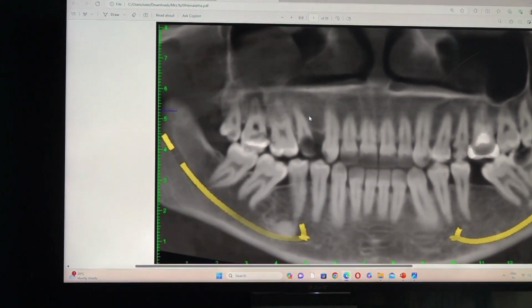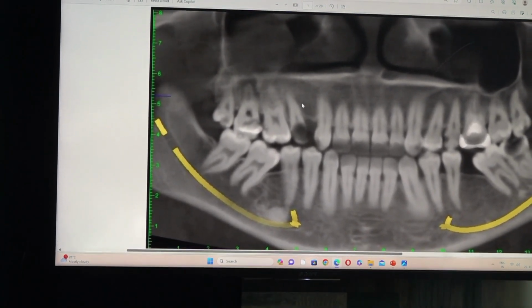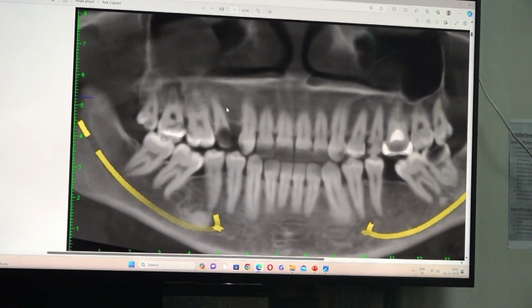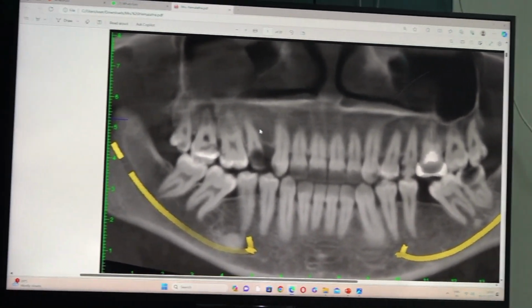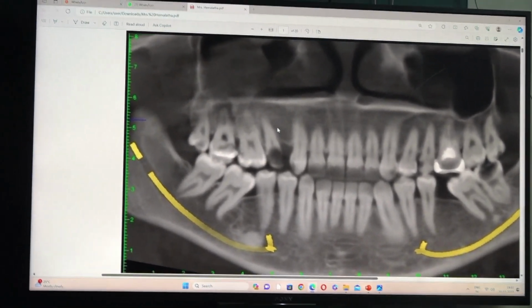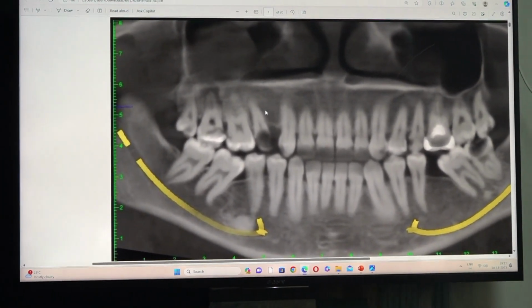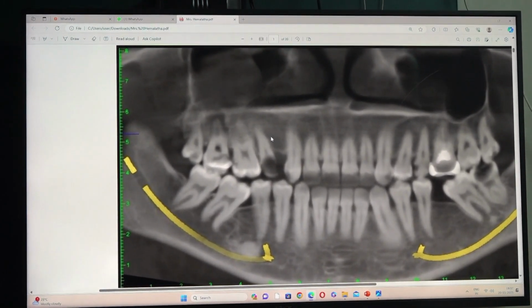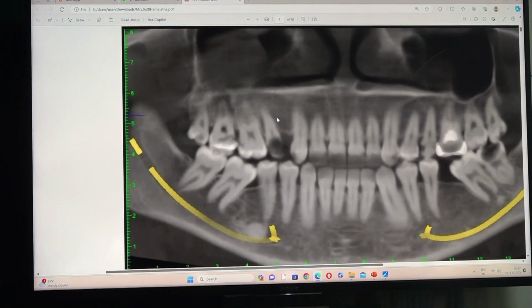Based on the width, you can select a wider or shorter diameter. But since there is a long length, I prefer 3.75 from Bioline. The length will probably be around 16 or 18. How will you determine the exact length? By drill drop. When you are drilling, you will feel resistance, which means you have reached the nasal floor. Then you drill further, you will feel the drop, measure it, and that is the length. So the tentative length is around 16 or 18.